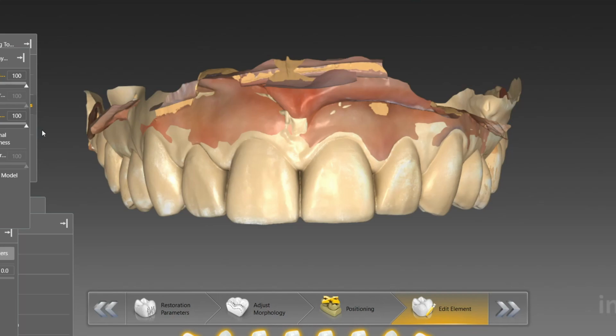And I think it was the dentist Gray Campbell. I was listening to a video of his on YouTube, and he was talking about if you can nail the centrals, and this is common sense for a lot of us, but I just love the way he put it. He said if you can nail the centrals, get those completely symmetric, completely ideal, the rest of the smile, you can throw in some asymmetries. It'll add to a natural effect, and you won't be visually thrown off because you still have that symmetry on the 2 front teeth. So, to put it nicely, I'm going to make some changes to the wax up. Patient is happy with this, however, so we're going to use this as a reference.